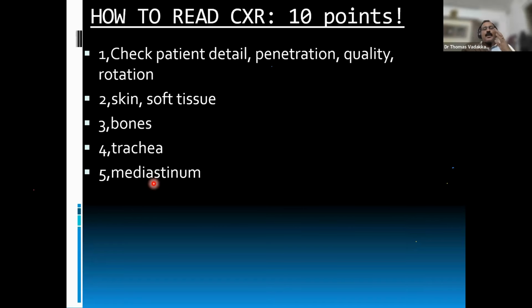Mediastinum from top to bottom, right paratracheal area, usually there is no widening. If anything is widened, then you have to think of the process of mediastinal widening. Then go to the aortic arch, the cardiac chambers, right atrium, also the left heart border, starting from the pulmonary trunk area, left atrium, atrial appendages, and left ventricle. Then assess the cardiothoracic ratio as well.